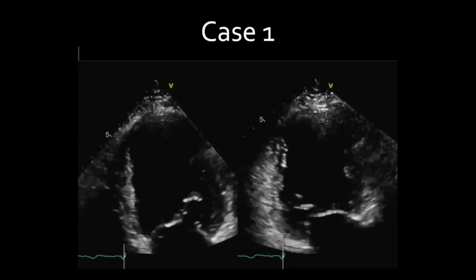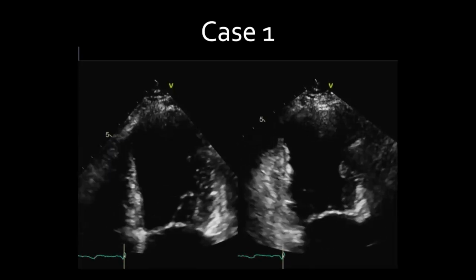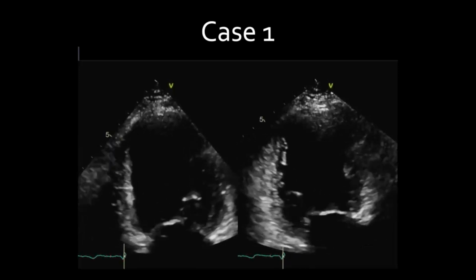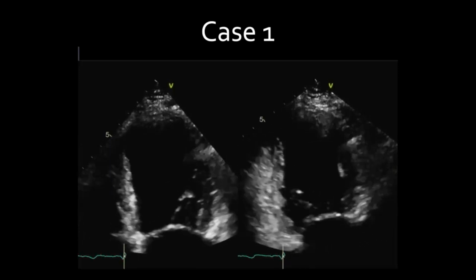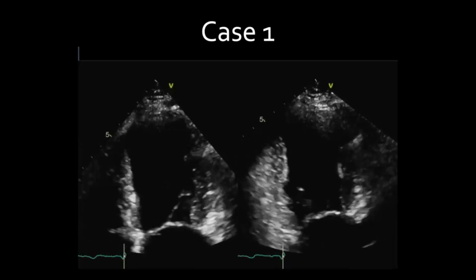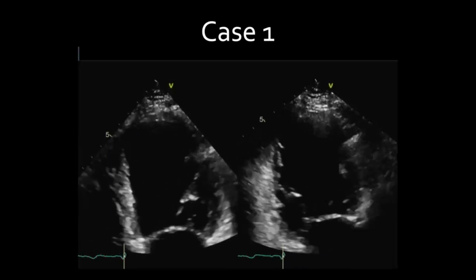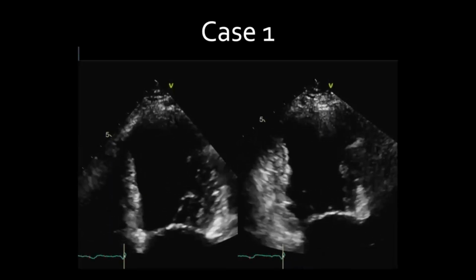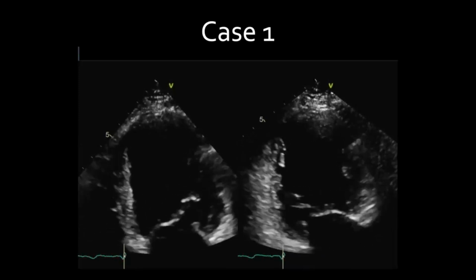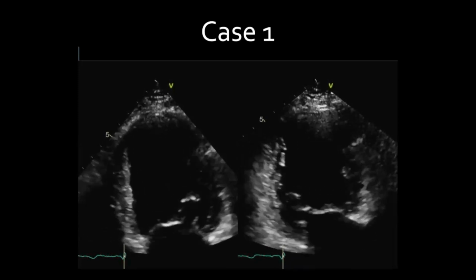All right. So what do we see here? It's an apical 4-chamber and apical 2-chamber view. Beautiful. And what else do you see, Grace? The apex is aneurysmal. Yeah, it's an apical aneurysm, quite a large one. Remember, an aneurysm is a shape distortion that is present during systole and diastole. So it's not just during systole; it's also during diastole. And many times, aneurysms are akinetic or dyskinetic.